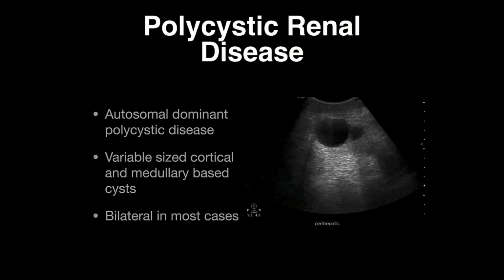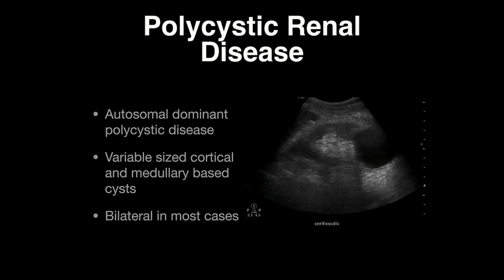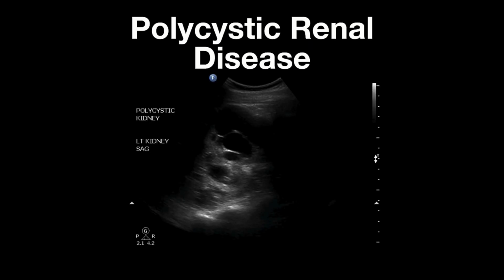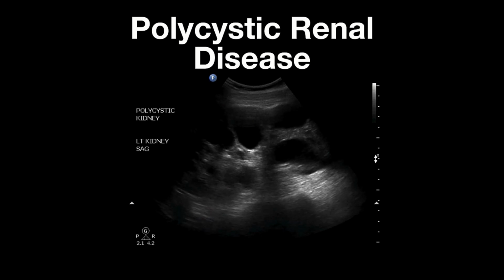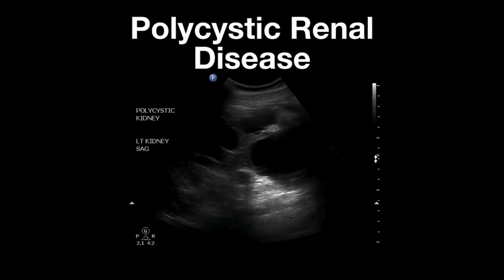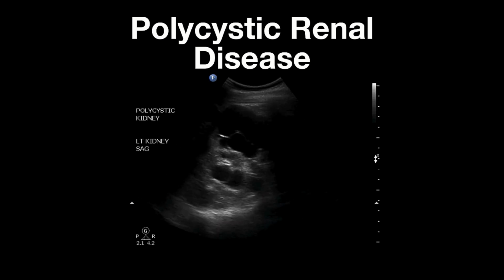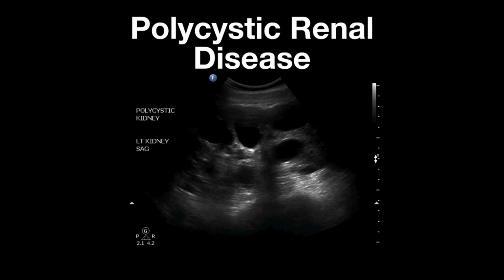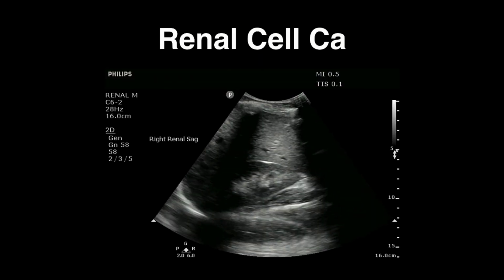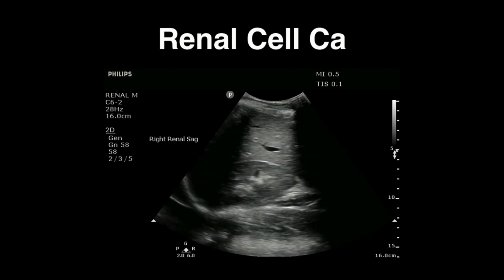Some patients may present with polycystic kidney disease. And these cysts can be variable size, variable location. Frequently they're bilateral. But the problem becomes when they're closer to the pelvis and you've got innumerable cysts there, it's going to be very difficult to differentiate hydro from all of these other cysts. So you have to understand that as a limitation. Anything, as I said, that is not a simple cyst requires follow-up.